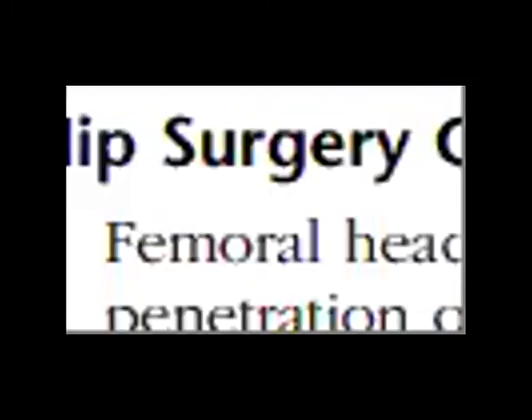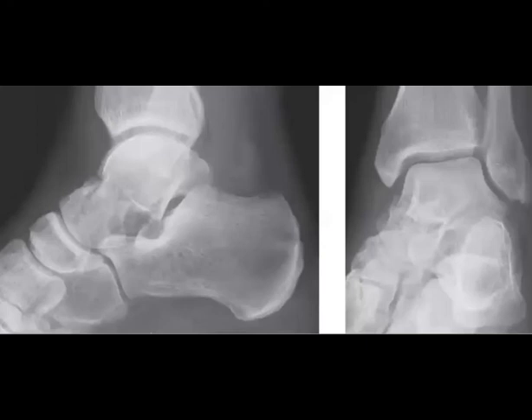You can confirm it by MRI. Sometimes it's not very easy, especially with this low quality MRI image, but you can see that there is a fracture line, especially if there is a STIR image. You can see the edema, the marrow edema. In this case of ankle, could you recognize the fracture easily?